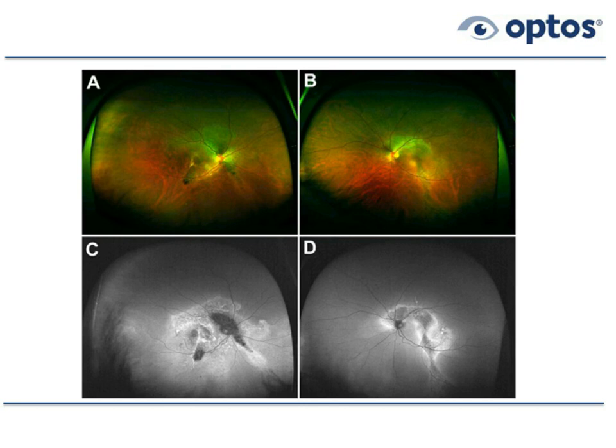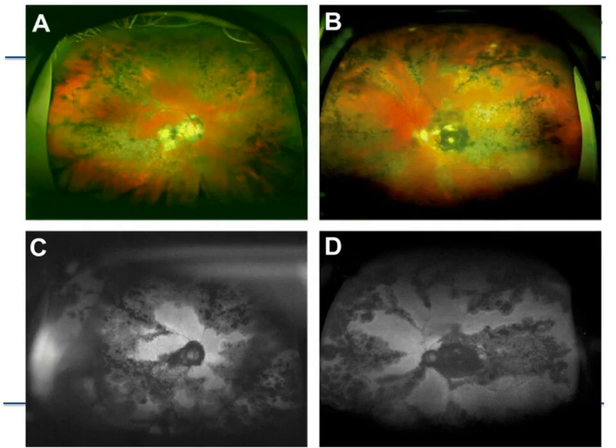In contrast, look at this patient. This patient has Harada's disease as well. We're looking at the color images above and the autofluorescent images below. Below, we're pretty much seeing only dark zones. And those dark zones are telling us that the retinal pigment epithelium is pretty much dead. But we're not seeing the bright zones as we saw in the case before.